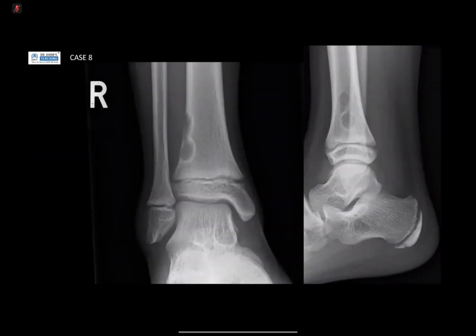Candidate 2? Yeah, so I'm given the frontal and lateral radiograph of the right ankle joint of a skeletally immature patient. I can see a well-defined eccentric cortical-based lytic lesion in the lateral distal cortex of the tibia, with well-defined sclerotic medial margins, narrow zone of transition, no periosteal reaction, and some deficient cortex on the superior part.